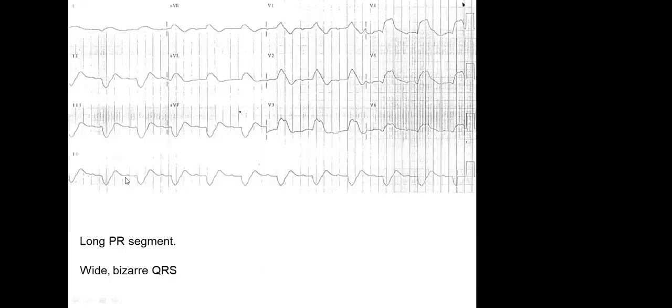When we see this ECG, there is prolongation of the PR interval. Why? Because there is a positive deflection of P, and we have a positive deflection of R in the QRS with a tall T. Again, P, QRS, tall T. When we started the presentation, we mentioned that we take lead 2 to check for the P wave and the PR interval.